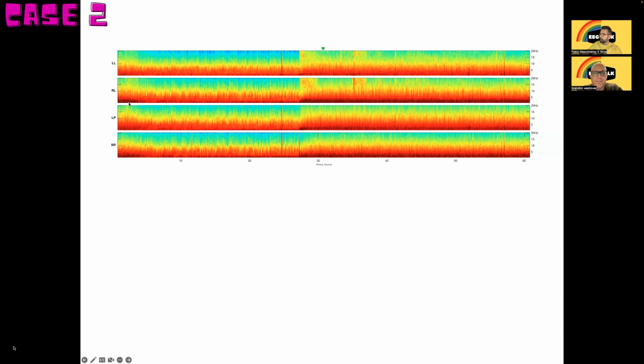And then I think there's even higher power at the bottom here because it's even redder. Does that word exist? Yep. Redder. Okay. Darker red at the bottom. So that would be around, if that's 5 hertz, that would be around delta, probably like 3 hertz or something like that. And I think it's spiky because the power is extending all the way up.